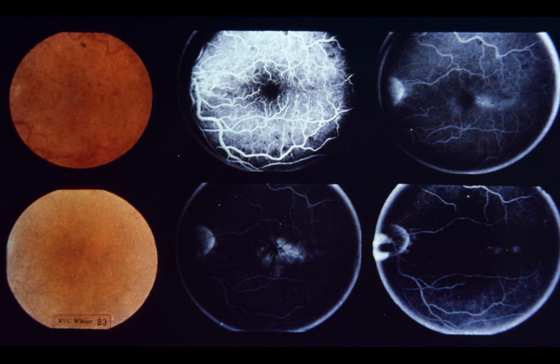Macroglobulinemia. This 62-year-old white female with macroglobulinemia and hyperviscosity syndrome complained of fatigue and gastrointestinal bleeding. Her systemic disease responded to intravenous Cytoxan. She also complained of blurred vision in the left eye. Visual acuity was 20/15 right eye and 20/40 left eye.